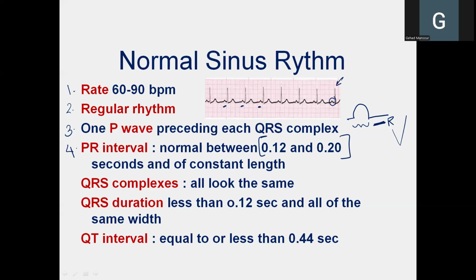The exact duration of the PR interval. Say, for example, that the width of the P wave was 3 small squares. This already makes 0.12. And then the PR segment was 2 small squares. So this means that we have another 0.08.